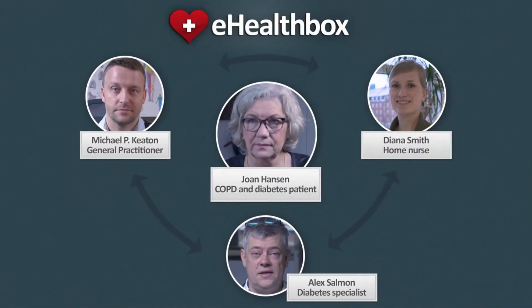This demonstration of the eHealth Box software will be shown from the perspective of 4 typical users, 1 patient and 3 medical professionals. These are a general practitioner, a specialist working at the local hospital, and a home nurse. Let's start with the patient.